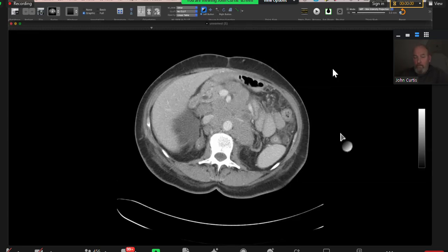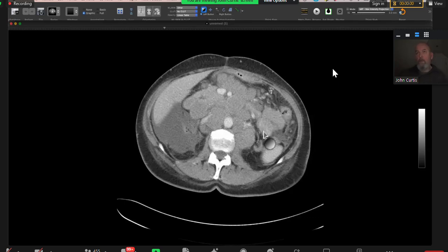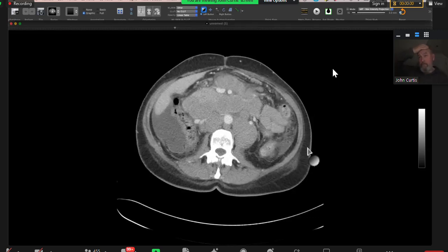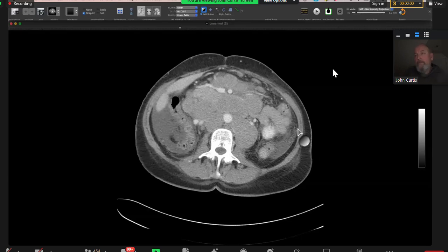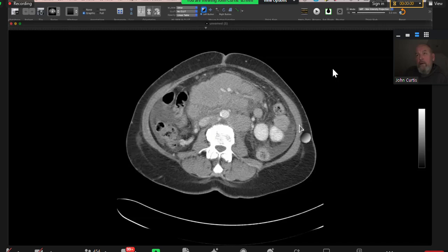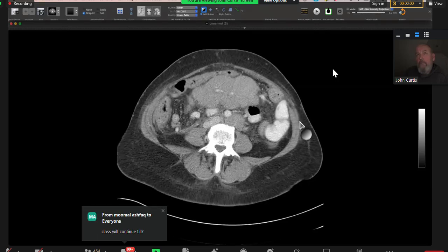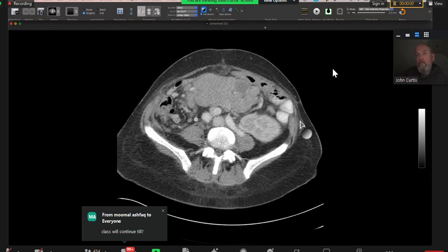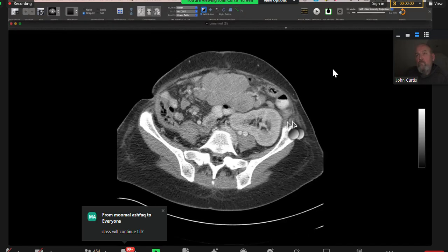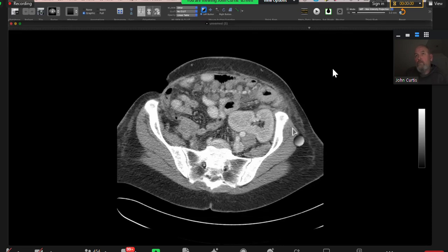So in the first look, I can appreciate that there are large enlarged lymph nodes that are making conglomerate nodal masses that are insinuating among the vessels. We've just crossed the 20 minutes mark. Okay, thank you. It's extending all the way from the celiac axis down below. And there's a transplanted kidney as well in the left iliac fossa. Yeah, good.